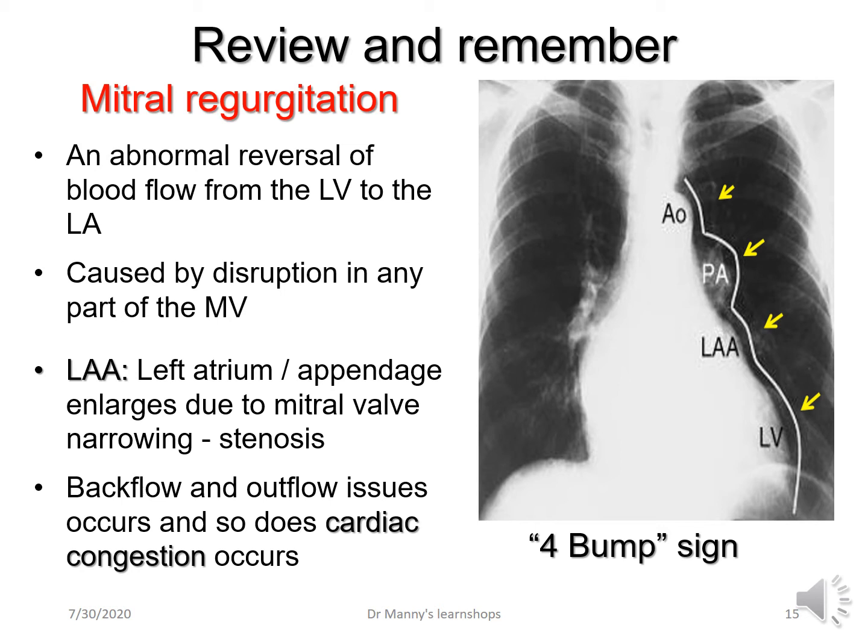This is caused by disruption in any part of the mitral valve. The left atrial appendage enlarges again, and there could be backflow and outflow issues which could result in what is called the four bump sign.